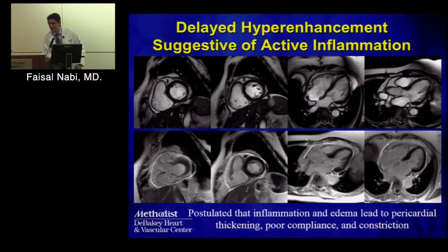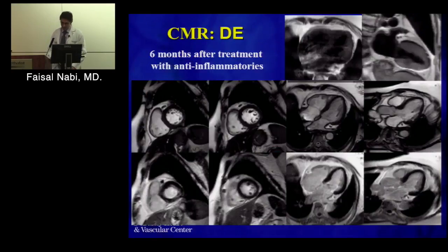So what does this mean? That means the extravascular space is expanded in the pericardium and it's taking up contrast, or it's taking up gadolinium. So what does this actually mean? Well, we'll come back to this.